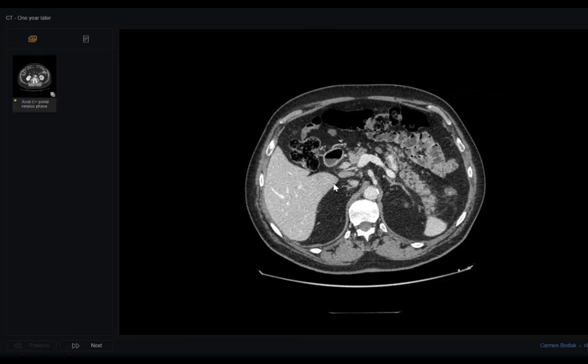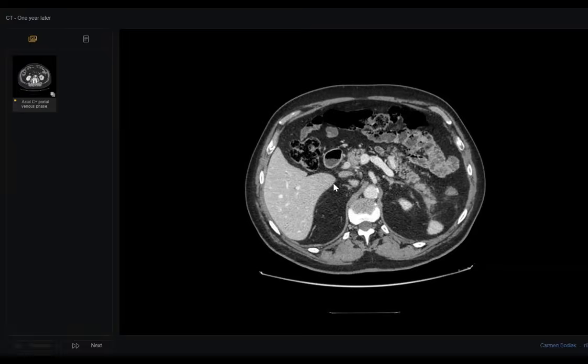Yes. For this intrahepatic biliary radical, I first have to trace the common hepatic duct. Did you find anything in the pancreas? No. Sure? Are you sure? Look again.